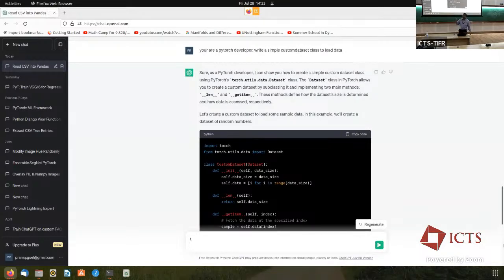This is boilerplate code. You can just cut and paste boilerplate code, but you then have to modify it and adapt it to what you need to do. Like, I have to know that I'm importing a PNG image, not a JPEG image, so I need to make sure that the code is right for that.